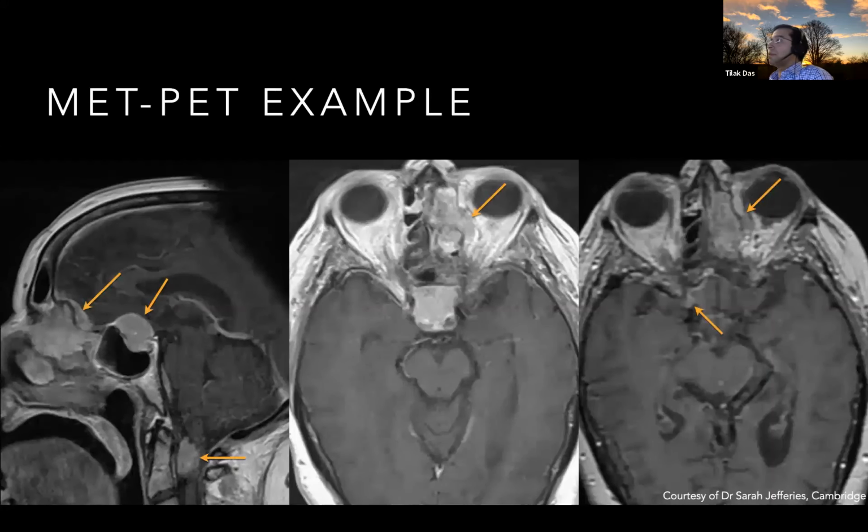And here's an example where a patient was undergoing radiotherapy, and it's just an example where occasionally we'll use some other type of imaging. We don't do any spectroscopy routinely here, but we occasionally do methionine PET. And this was for a case of atypical recurrent meningioma, where they had 3 sites of meningioma, at the craniocervical junction, planum, and in the ethmoid region extending into the orbit.